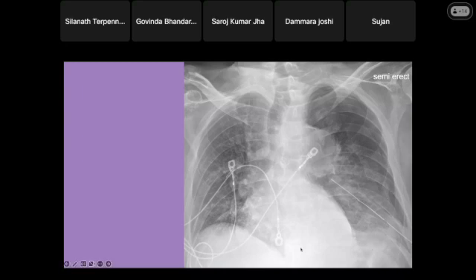Okay, all right. Let's look at the abnormalities here. What about the lung is bad? That's one abnormality I want you all to pick up because this is critical.